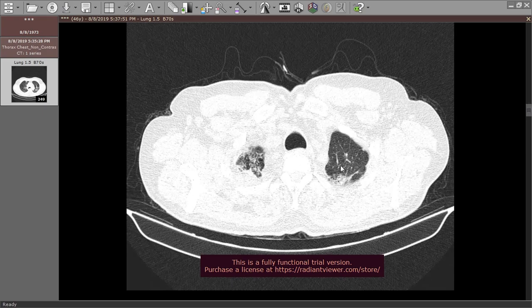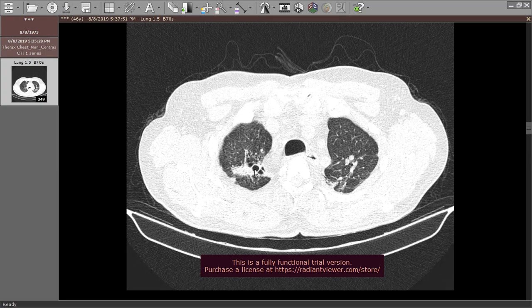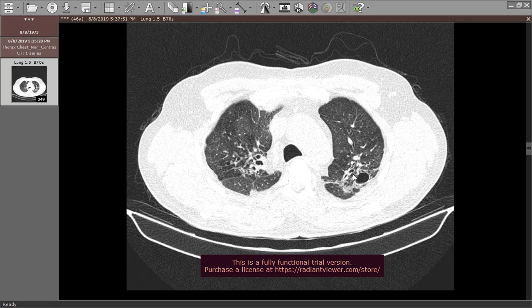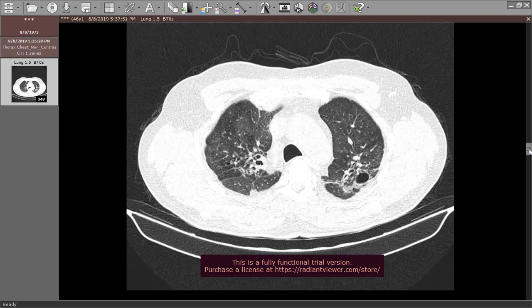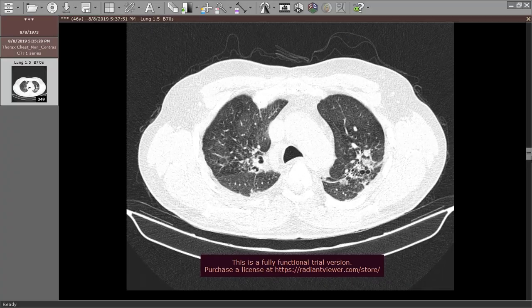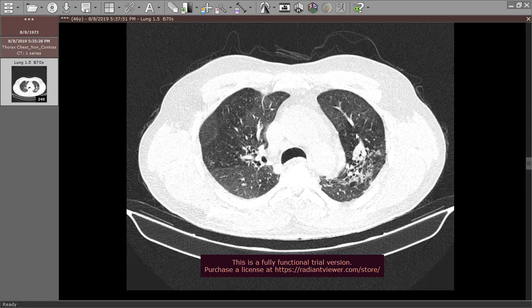It's fibrotic bands, as you see, fibrotic changes accompanied by cystic changes, maybe cystic bronchiectasis as well, maybe traction bronchiectatic changes as well. As you see here, they are reaching the fissural space, maybe accompanied by areas of air trapping.